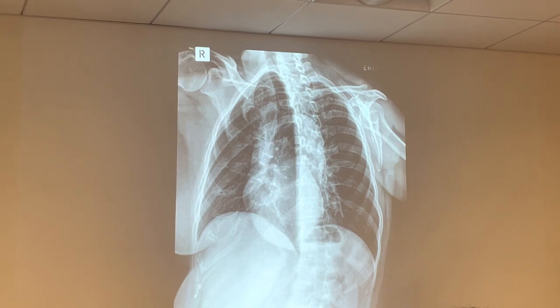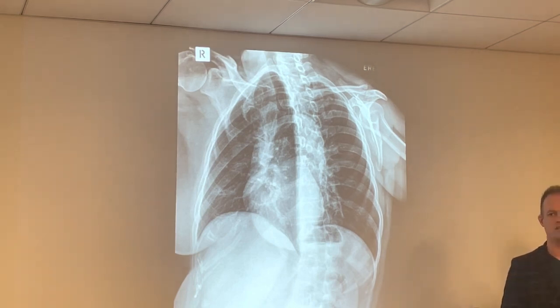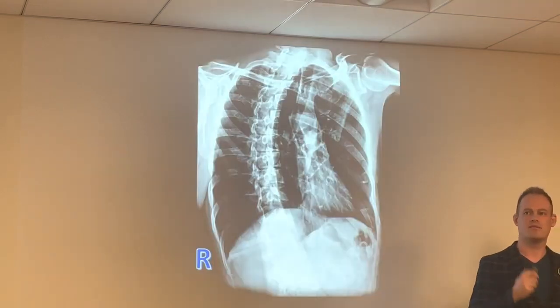Right side's marked and elongated, so that has to be RPO. RPO, because the side is touching, it's down, but also elongated. Y'all see where I'm going with that? Yeah, but why are the clavicles looking like that? Because it's an AP oblique, projection instead of a PA. Also because obliques are going to make clavicles look funky. But we're not worried about the clavicles.